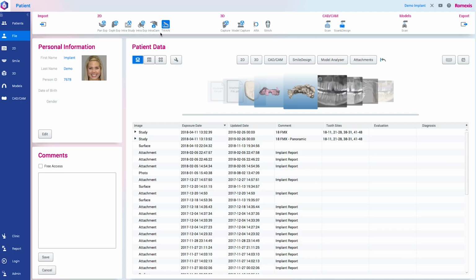Yeah, then we have uniformed this upper toolbar a little bit, because in the current version, depending on from one module to the other, those buttons might be in a little bit different order. But now we have wanted to put import always to the left and export to the right so that we can more easily find them.